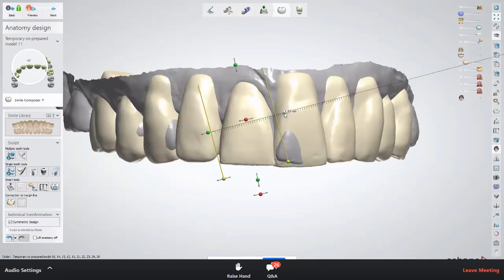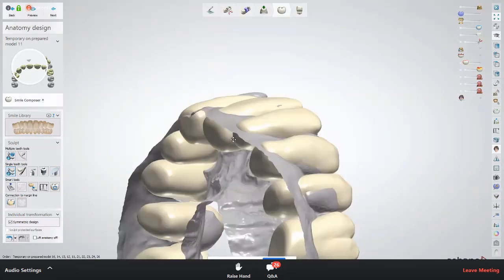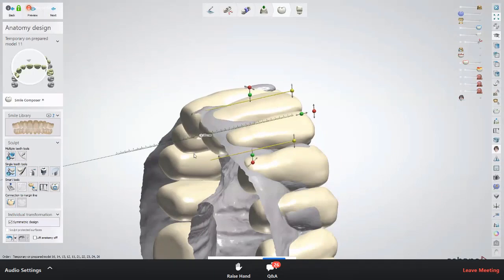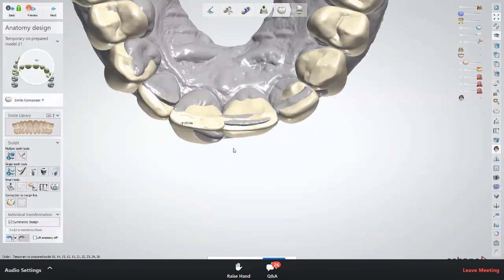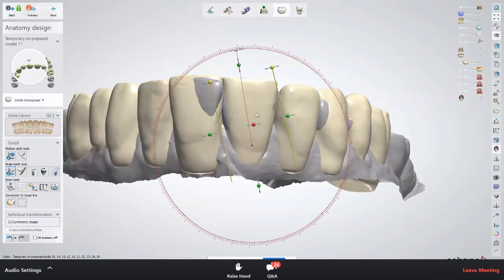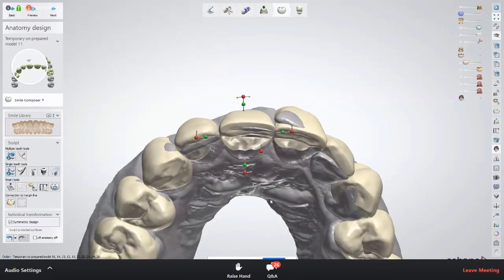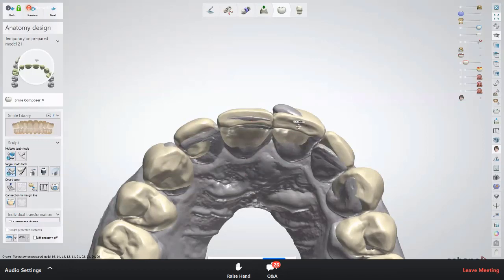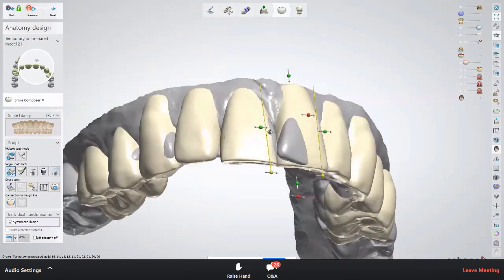It's also dependent, of course, on what the patient has in mind, because if the teeth are way outside, then of course we have to do something about it. Like in this case, we're going to have to do something about the sticking out part, which I'm going to show you how I'm doing. It's actually quite easy, but let's go back to that a little bit later. Right now we're going to leave it as is. So now we can see how much we're going to remove.